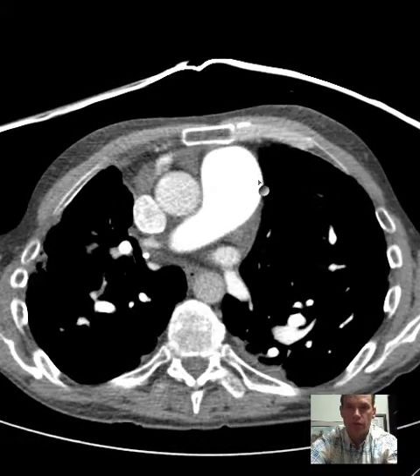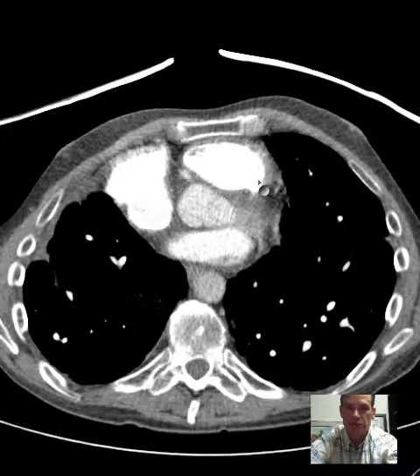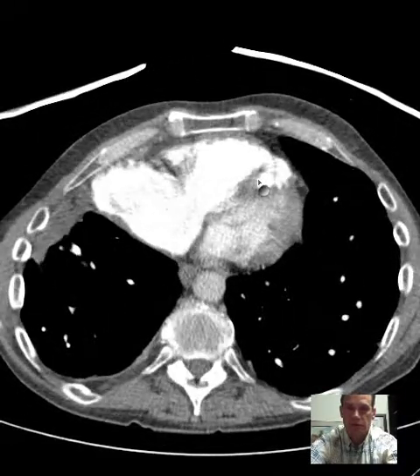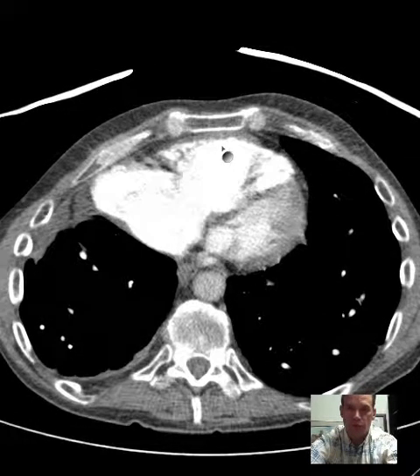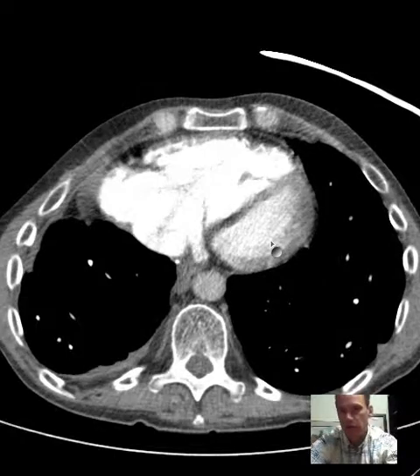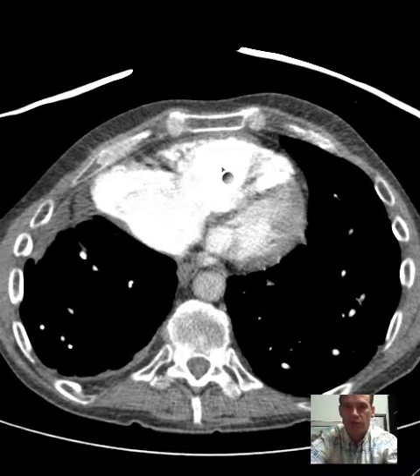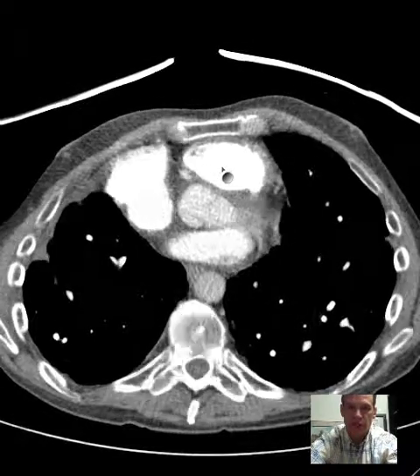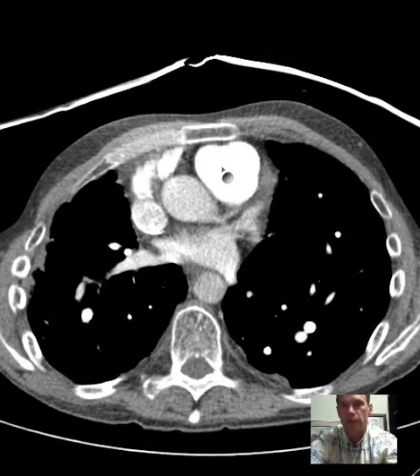We'll kind of skirt up a little bit and down. So where's it coming from? It's coming from the right ventricle, right? The right ventricle is more anterior, the left ventricle more posterior, and the left ventricle has a thicker myocardium, although not all that thick in this particular case. So it comes from the right ventricle. It's positioned anteriorly in the mediastinum. What is it? It's the main pulmonary artery.